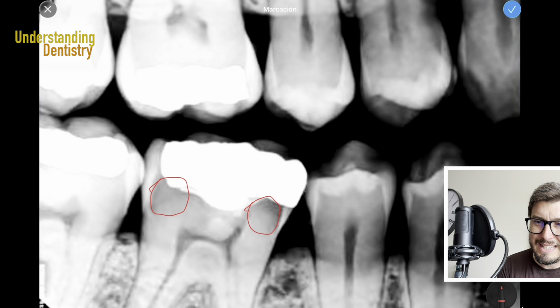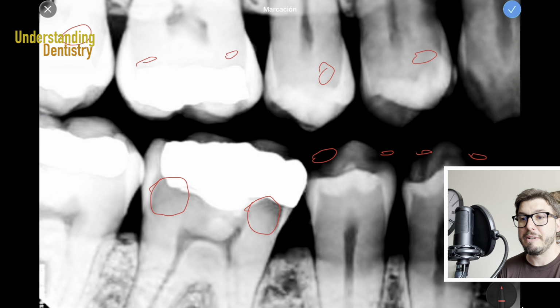And then you are seeing that even differences of the dentin are now more highlighted here, but you have a lot of contrast. You are not seeing, for example, the rest of the cusp of this premolar, and this tooth, for example, is entirely white, so maybe if you have initial caries here, we are not seeing properly, okay? So not the ideal situation.